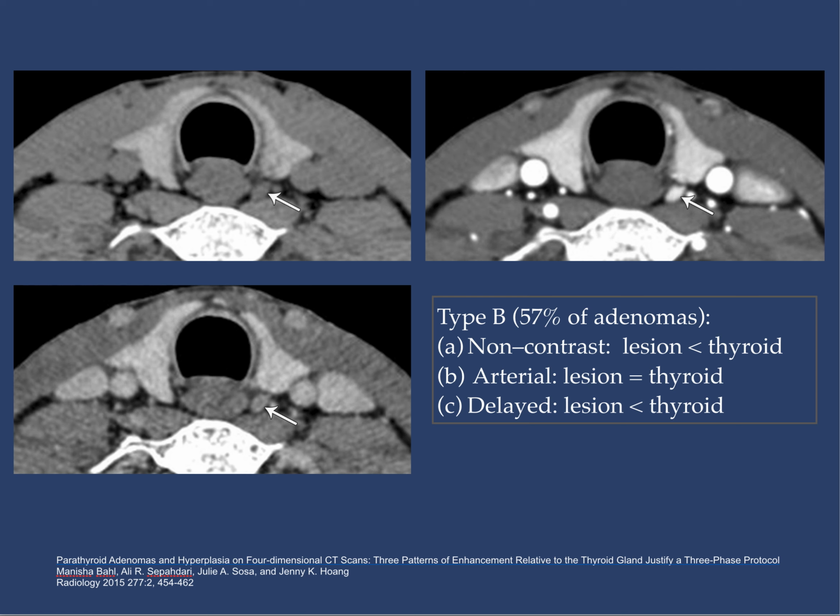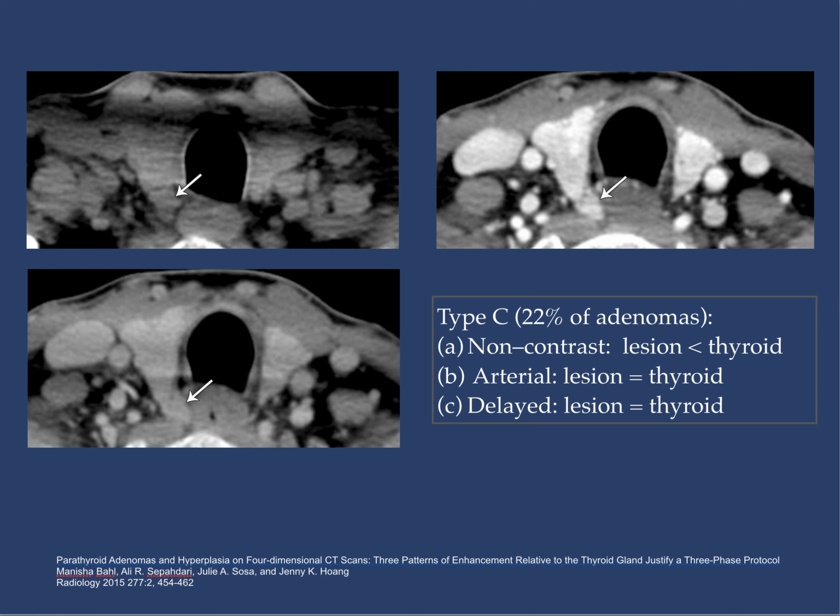Sometimes not easy, because it's difficult to tell from regular lymph nodes. I'm sure with our current dual energy CT, this would become even easier, although I don't really have a lot of experience on dual energy CT with this type of lesions. Again, in many centers, multi-phase CT has replaced sestamibi and ultrasound.